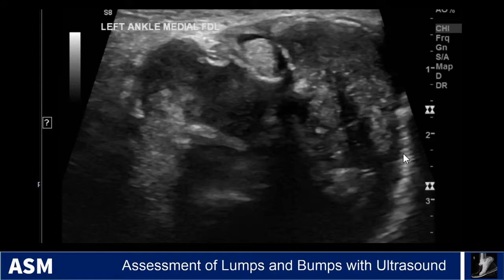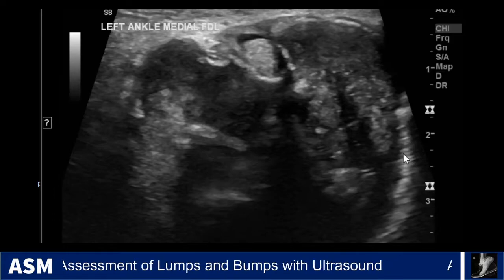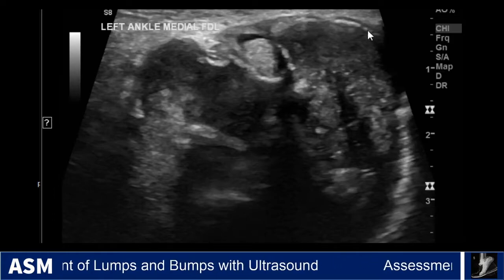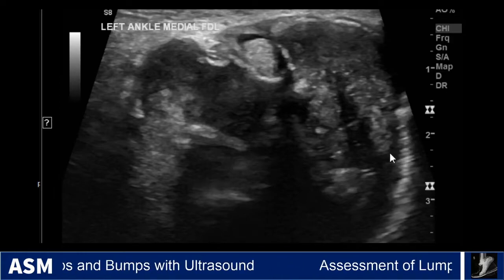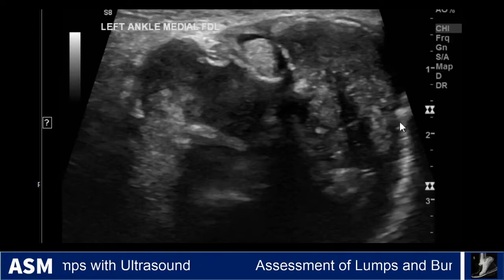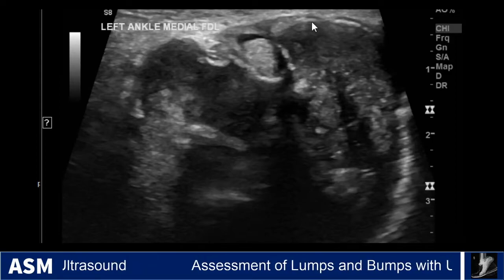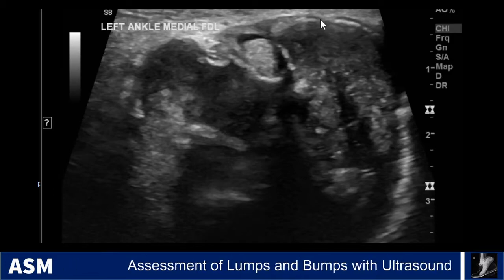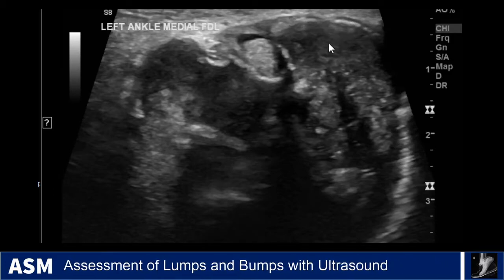Case number 4 is a young female patient with soft tissue swelling and a mass at the left ankle. Ultrasound was performed, which shows a large, aggressive appearing heterogeneous soft tissue mass along the posterior medial aspect of the ankle. We can see it eroding into the adjacent tibia here, and then we see these thin hyperechoic lines here. This is the blown out cortex as the mass expands out from the bone.